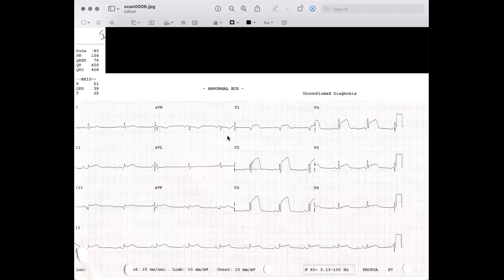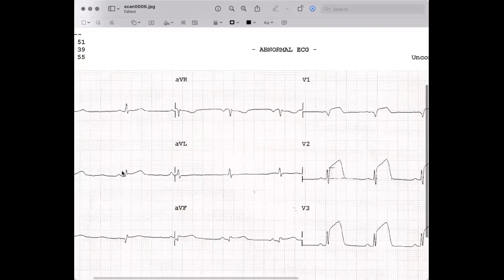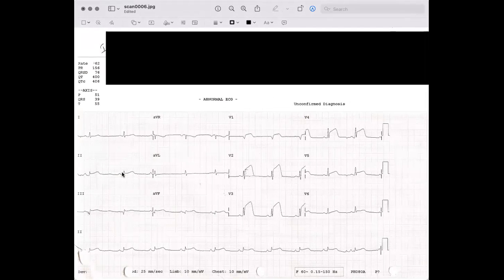Here, lead V1, it doesn't look really wide or peaked. The same thing here. The first part or the later part doesn't look really enlarged, suggestive of atrial enlargement. So there isn't. We'll talk about chamber enlargement in a session. But next, I will check QRS wave abnormalities. Do you feel it is wide or the voltage is high?